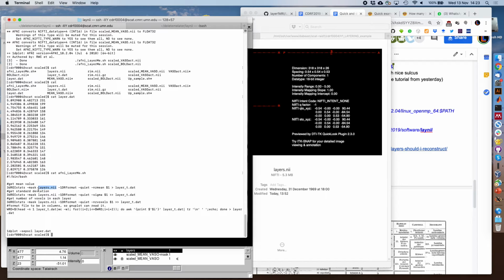Are there any other questions? If I want to do this for a couple of slices, is that possible? Absolutely. The layering algorithm is a 3D algorithm. It's growing a distance metric, and that's inherently 3D. The 2D example was just for convenience. Especially in the visual cortex, you need to do it in 3D.